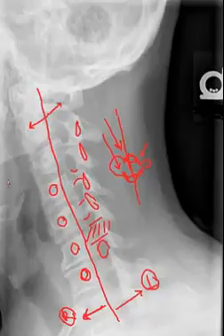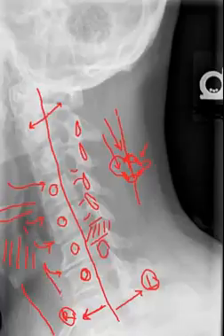Just to finish up with some anatomy here, these are the intervertebral disc spaces. This patient is demonstrating a little bit of narrowing at this particular level with some osteophyte formation, simply a sign of degeneration. Here we see the hyoid bone. There's some thyroid cartilage calcification present in this patient, as well as the air column here in the trachea, as well as the larynx and pharynx.